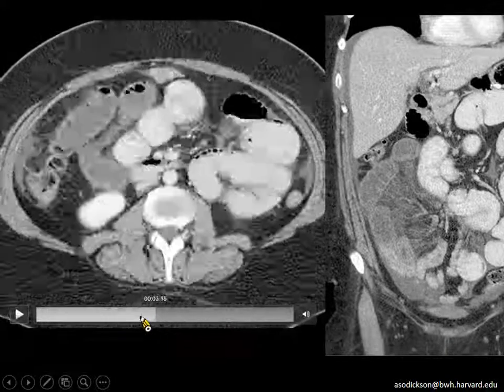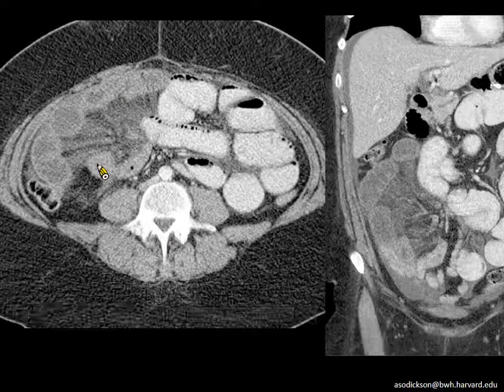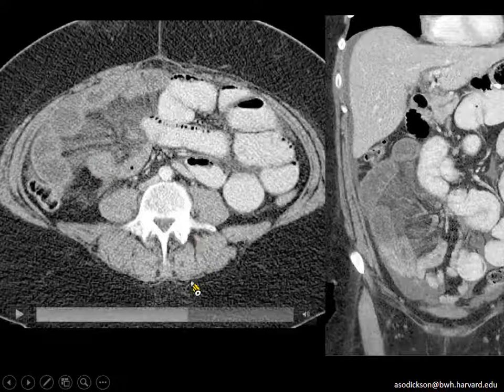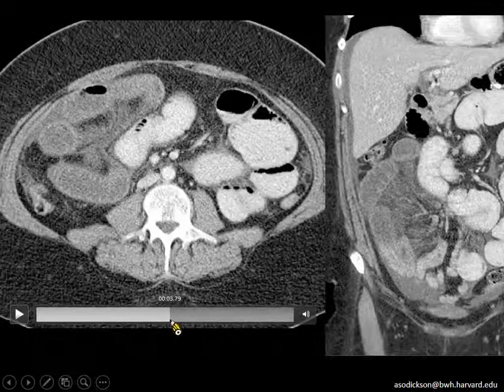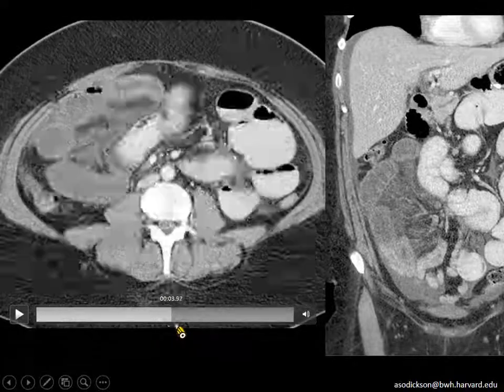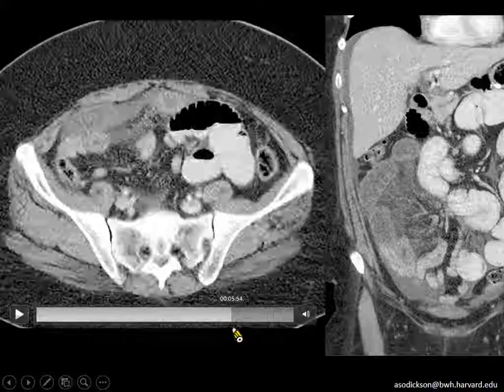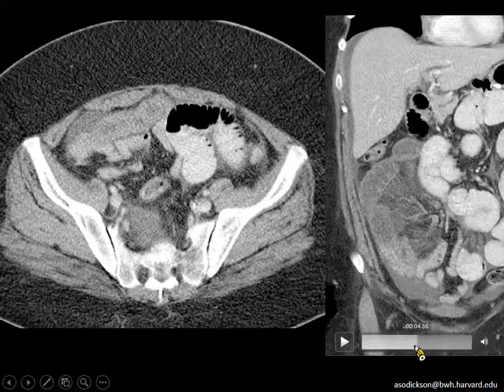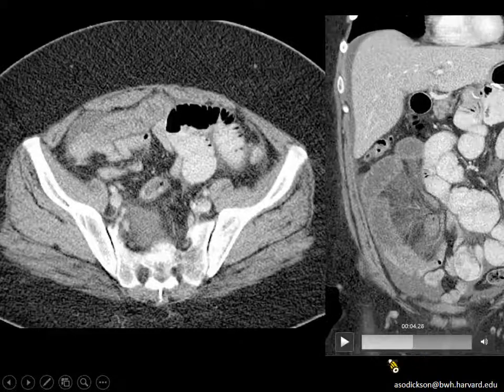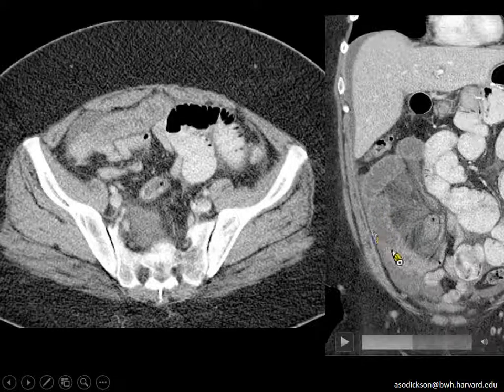And this patient has some concerning findings. We have here a large amount of mesenteric fat stranding or engorgement. We have some wall thickening of these affected loops here. And there's a suggestion that we have differential mucosal enhancement. We do see a little bit of iodine enhancement in the wall here, but if we compare to the distal loops that are decompressed, you can see that there's much more avid enhancement here. So maybe we can see this better on our coronal images. Here, we see this looks a bit dusky. It looks like it has a bit of diminished enhancement compared to these decompressed loops distally.